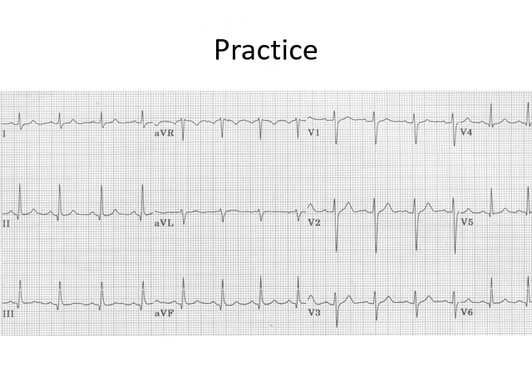I am going to take a 1-second pause. Alright, let's have a look at ST segments. If I were to see the ST segment of lead 3, this is the ST segment, and to compare, I would like to compare it with the TP segment. This is the TP segment. You can pretty much say that TP segment and ST segment are at the same height. So with respect to ST segment, this is a normal ECG.